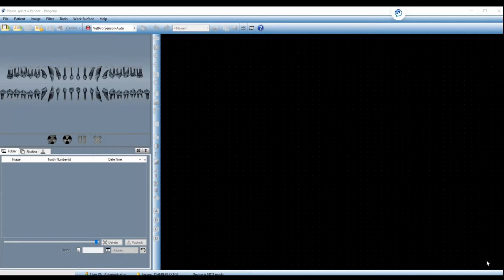Welcome to the Midmark Imaging Software tutorial. Thank you for trusting Midmark with your purchase of our digital dental sensor and software package. We will break up this tutorial into multiple short sections and recordings in order for you to focus on certain areas or go back to review sections you need additional time learning.